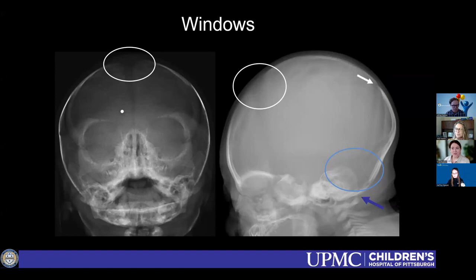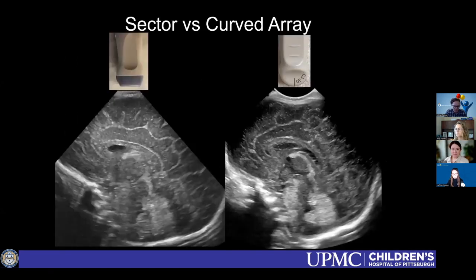You all know this as pediatric radiologists, but the whole reason we are able to do this is because we have these beautiful open windows in the skull to put our transducer and see. All of these marked arrows are places that we can use as windows. This kid did have a palpable abnormality, that's why there's a BB here. But our primary workhorse is the anterior fontanelle. And then we use a lot of the mastoid fontanelle also. The posterior fontanelle and foramen magnum we really only use for problem solving. It's not part of our protocol.